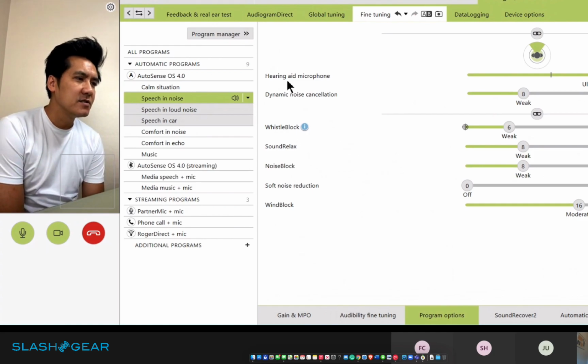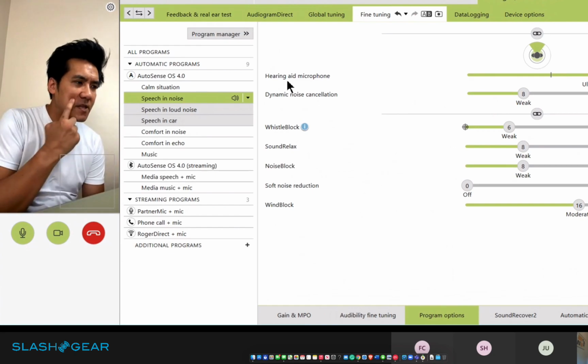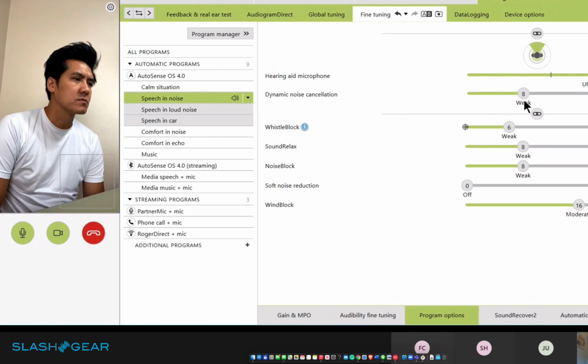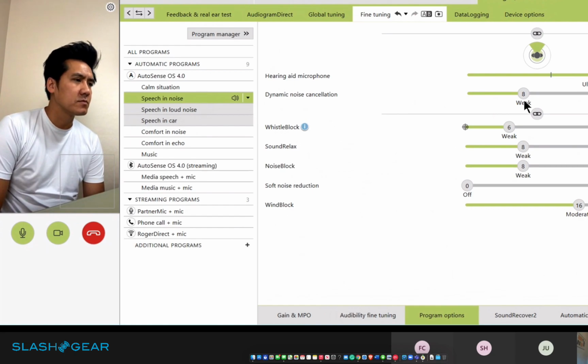What's cool about this feature is how we're training the hearing care professionals is to have the end user, the clients, adjust it yourself. Mm-hmm. So we have the default setting, but really the best benefit is for the clients to take the app and go to the environment and adjust it, because dynamic noise is going to change dramatically. If we take restaurants, for example, you can go to the same restaurant at different times of the day, and the noise is going to be quite different.